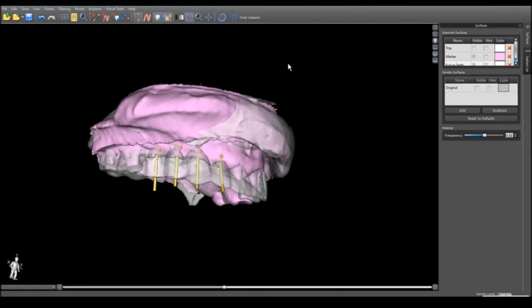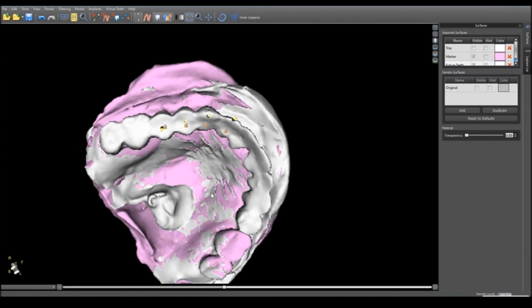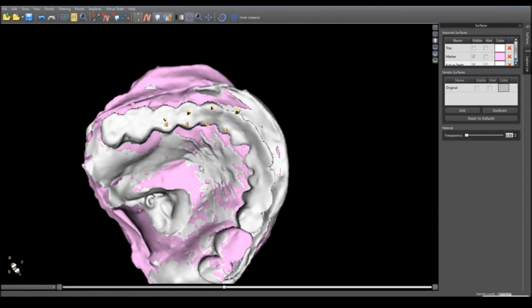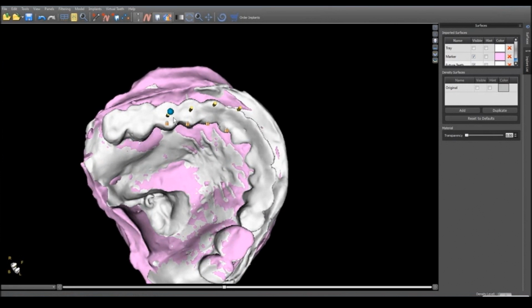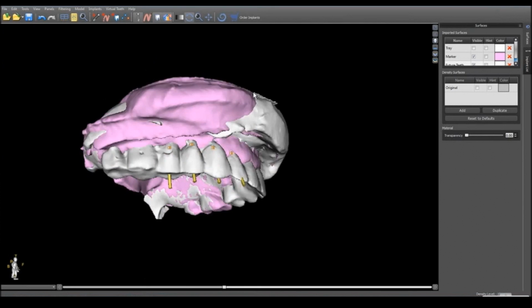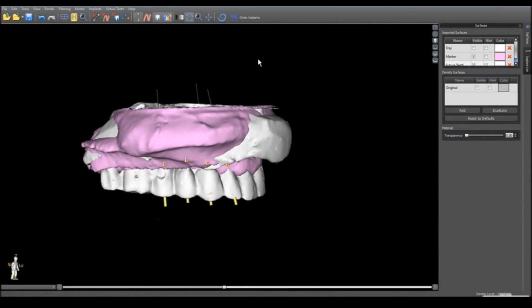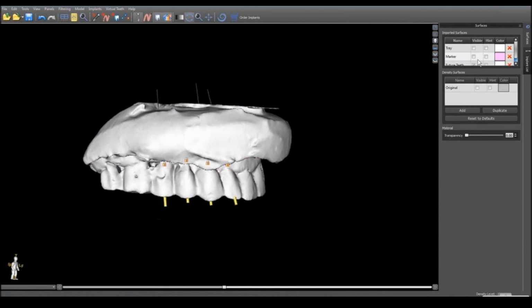First, I shot for ideal position. So that was in the mesial distal dimension. And then buccal lingual, I'm able to see exactly where these are. The center line of the implants are in the center of each bicuspid, incisal edge, incisal edge. So that was the first phase of planning. I'm able to project the outlines of the temporary bridge onto the cross sections.